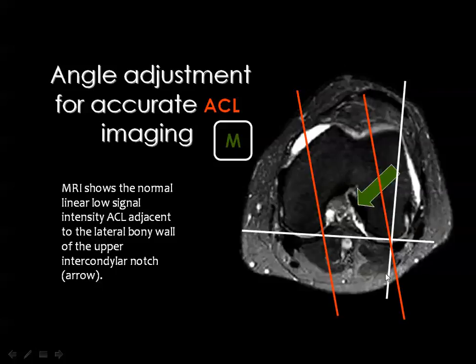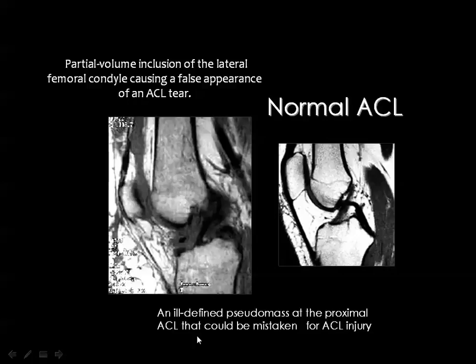If you cut the sagittal images like this, you will definitely cut the course of the anterior cruciate ligament, and if it is present, it will be shown clearly in the images. In this particular example, you can see both the anterior and posterior cruciate ligaments appearing in the same section, but frequently the anterior is seen in a different image than that where the posterior cruciate ligament can be identified.